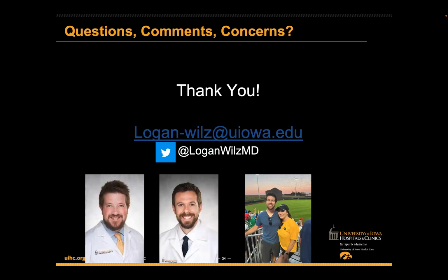Looking at your image, especially when you were showing your EHL pathology image, you can pretty clearly see the retinaculum running over the top there. And so I oftentimes will, similar to you, say I didn't maybe formally image the entire thing and the roots, over towards the sinus tarsi and then medially. But you are typically looking at it if you're scanning through the anterior ankle. So just paying attention to whether it is thickened or anything like that in that area is helpful.